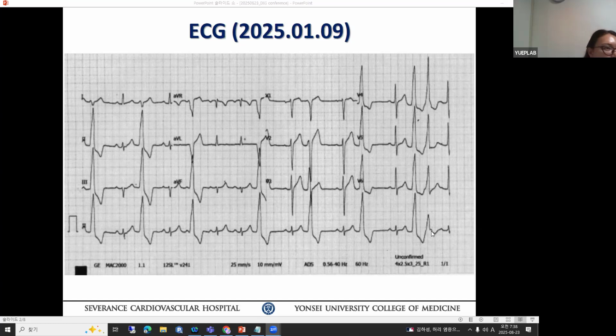But if you measure the PP interval, what did you measure with a finger? How does it look? Does it fall into that QRS complex that we did not see? In other words, this PP interval you measure here, it falls inside the QRS almost, right? Therefore, it's possible this is a fusion, because there's no VA conduction, I would like to argue. If it is a fusion beat, the conduction system related to the narrow complex should overlap, but if we consider the refractory period of the previous PVC, it is too short.